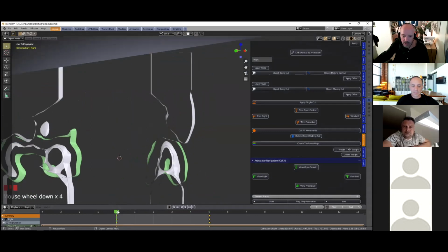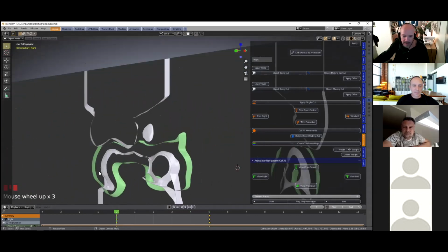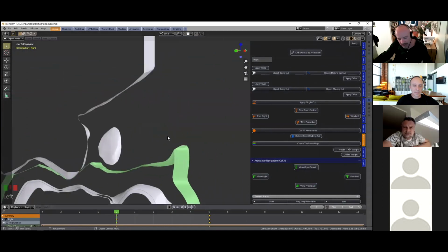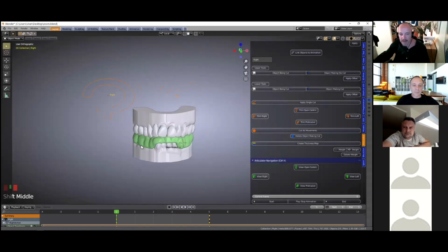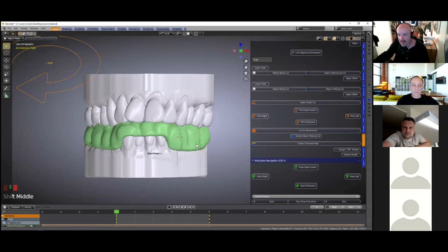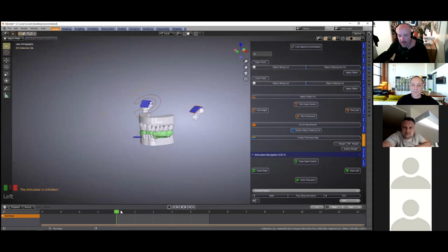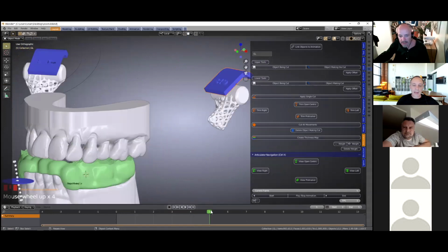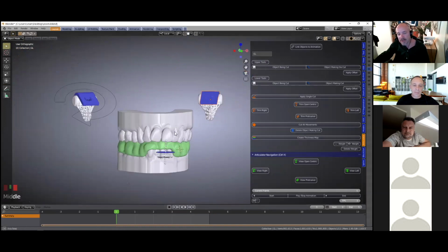I can look anywhere, and we can see over here, for example, it's all being cut according to our movements. Our jaw is at rest in some way, because as it moves down the condyle, it's all been calibrated. It's all been cut. Yeah, occlusally it's been cut.